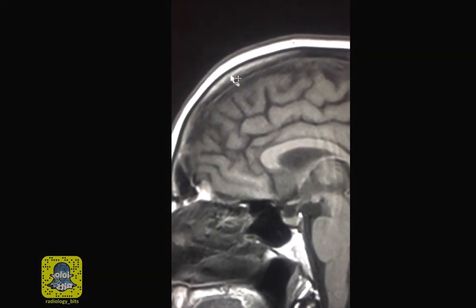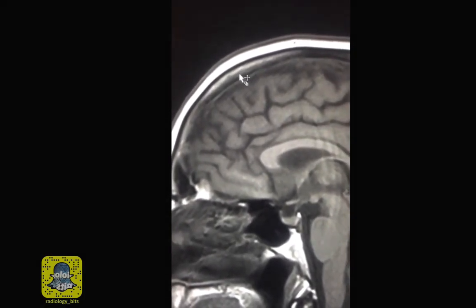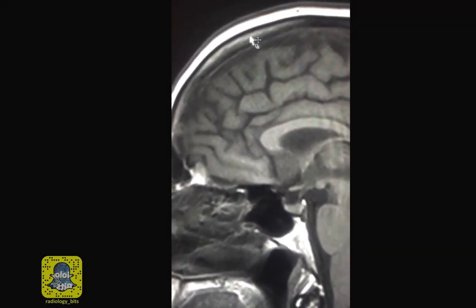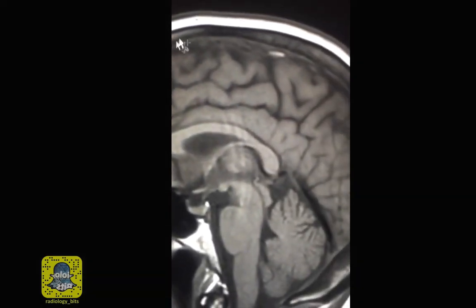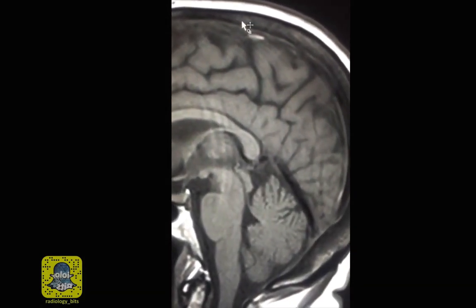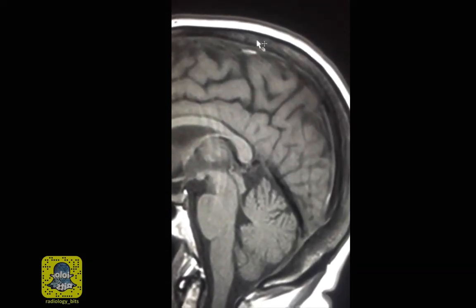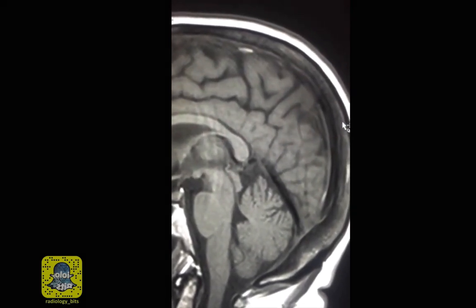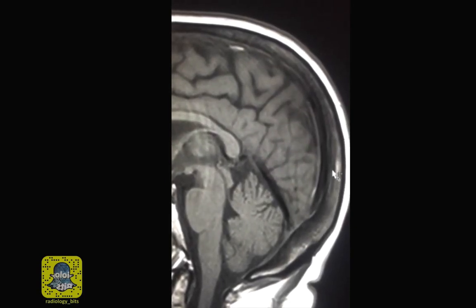So in an adult, if you have lots of darkness of the marrow on a T1, you have to think about physiologic or pathologic replacement of the marrow. Now this area of the calvarium appears normal because it's bright on T1. However, let's look at the other areas posteriorly here. So on this T1 image, there is replacement of what's supposed to be a bright marrow by what appears to be dark here. Although heterogeneous, you have to think about bone marrow replacement.